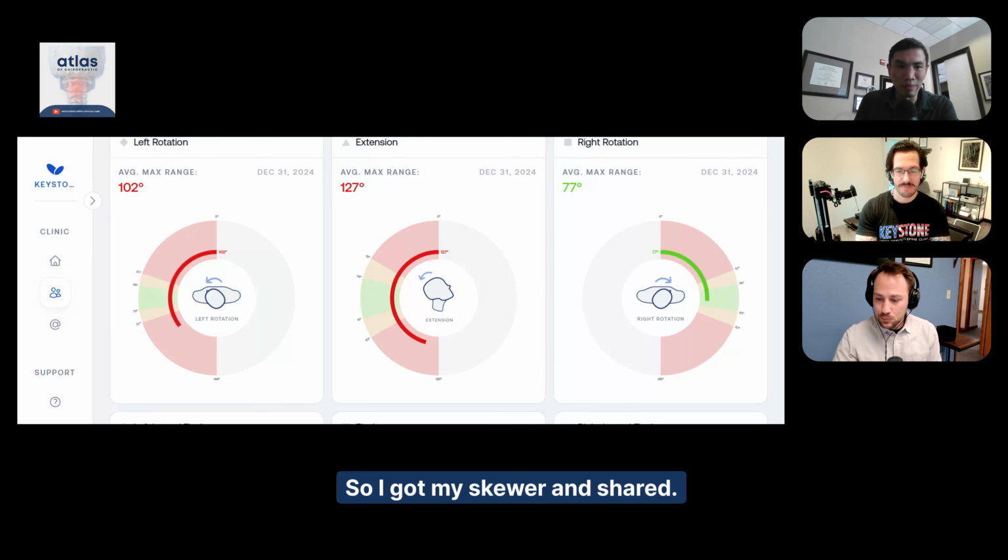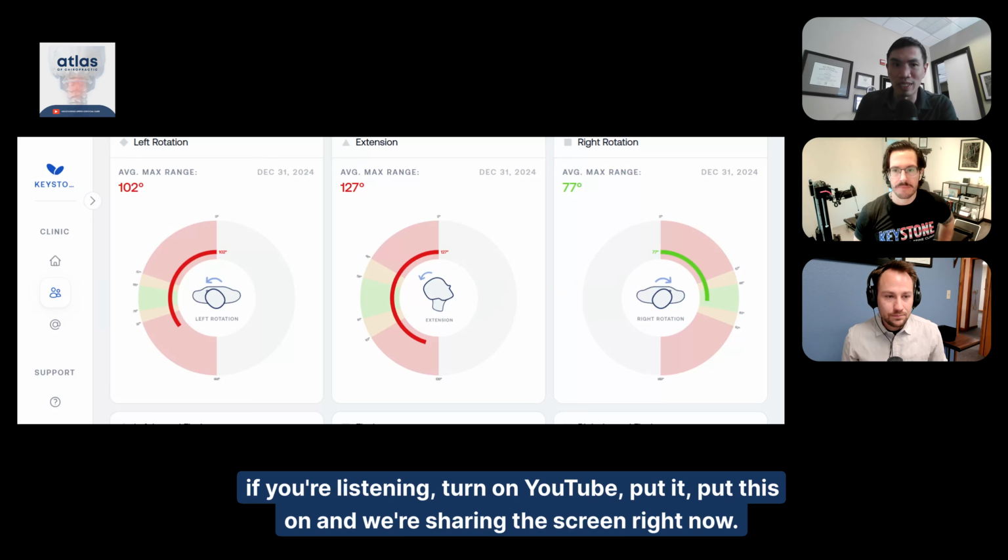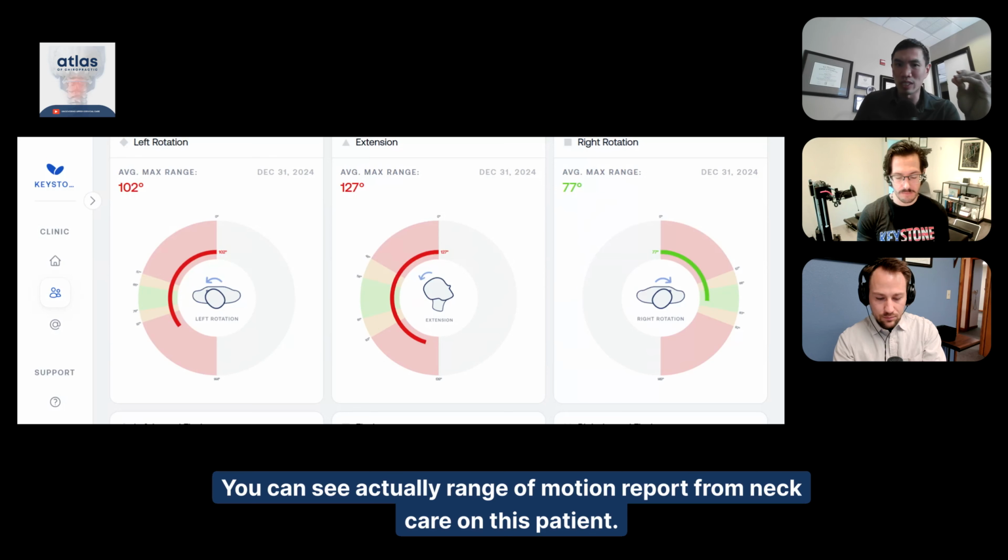For sure. So I got my screen shared. So if you're listening, turn on YouTube, put this on. And we're sharing the screen right now. You can see the range of motion report from NeckCare on this patient.